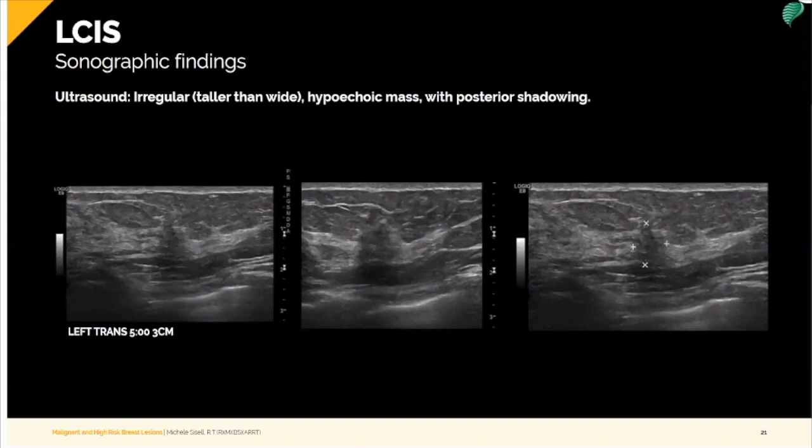So the patient did have an ultrasound, and because of that architectural distortion, and because on that 3D slice we were able to tell that it was on the lateral edge, we were able to scan that whole lateral side. If you're looking at a 3D slice in particular, you should be able to tell, as long as the nipple's in profile, if it's on the upper or the lower half of the breast. This one in particular was on the lower portion of that 3D slice on the CC view. So now we knew it was on the outer and we knew it was lower, so outer lower quadrant.